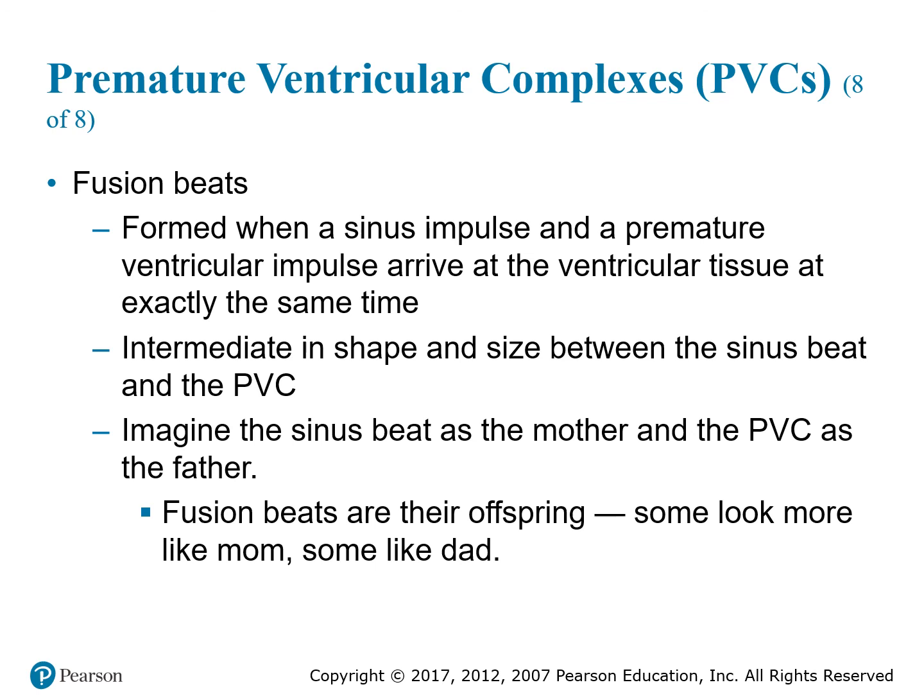Fusion beats. This is another particular type of PVC. A fusion beat is the result of an electrical impulse from a supraventricular site discharging at the same time as an ectopic site in the ventricles. Because fusion beats are a result of both supraventricular and ventricular depolarization, these beats do not resemble normal beats.